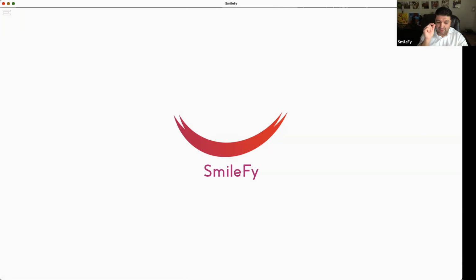What part did we not consider when we created everything from the beginning? Digital dentistry is beautiful because you can fail the planning, you can fail the idea of the treatment planning, you can fail everything and not harm the patient at all. So we can replan, we can redesign, we can do everything new until we find the best solution.